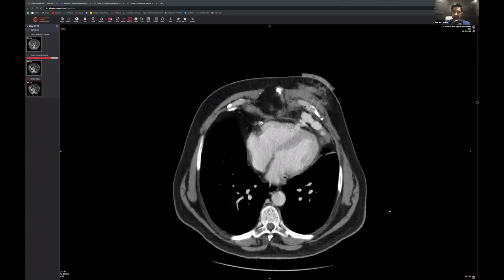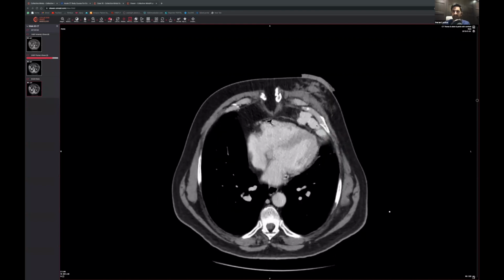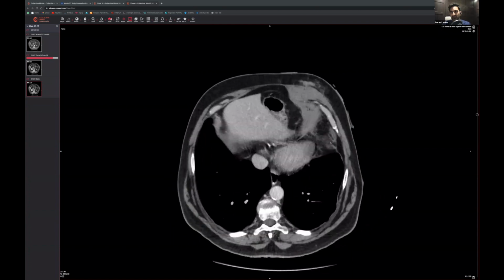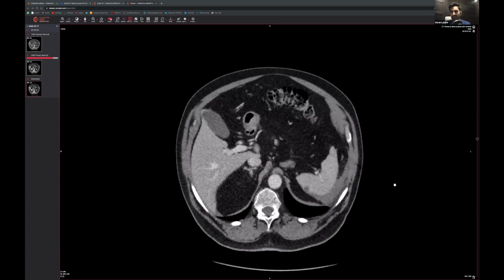We've managed to take the scan in the middle of them essentially bleeding out of their heart and into what looks like their diaphragm or the cardiophrenic angle area. And that's probably a lot of why there's so much blood seeping down this way. You can see that. Yeah, and then going along the diaphragm like so, and along the edge like this as well.